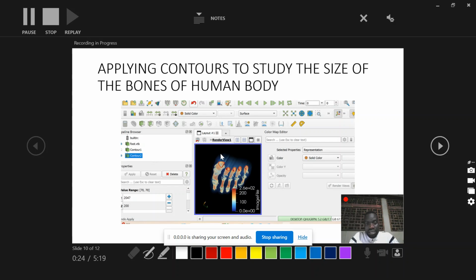So here I can determine that usually the fats will concentrate on the big bone, so many fats, and then on the second bone there'll be little fats, and so on with the size of the bone. So the larger the bone, the larger the fat concentration.